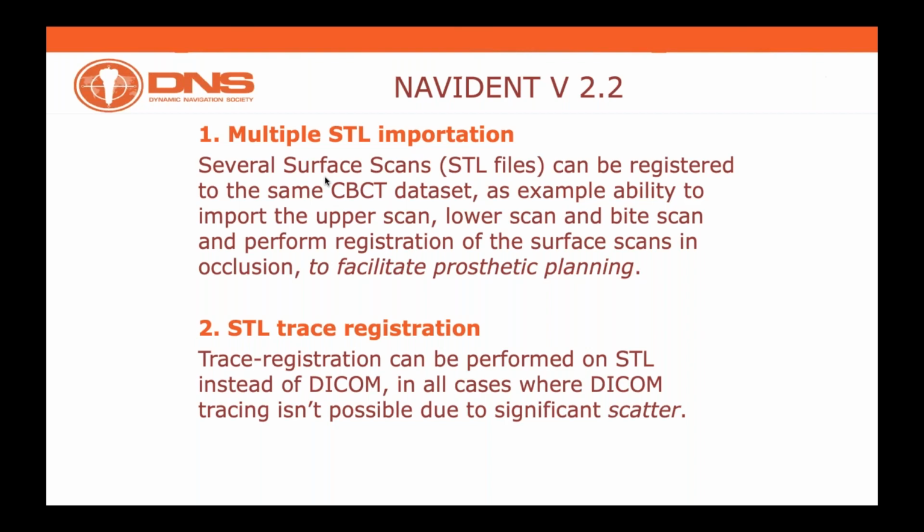So those cases where the scatter is significant and the artifacts hinder the opportunity to trace the patient's crown because of the metallic restoration. In those cases, when the artifact is king, then tracing the patient's tooth and matching the tracing of the patient's tooth with the 3D rendering of the DICOM dataset is really problematic.